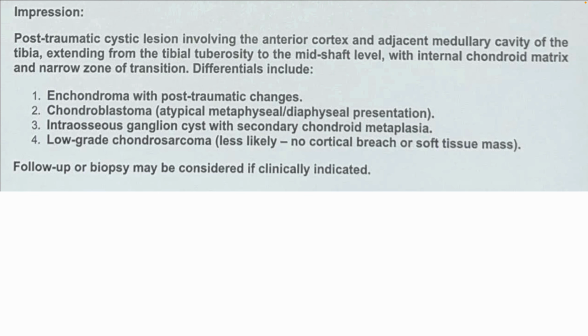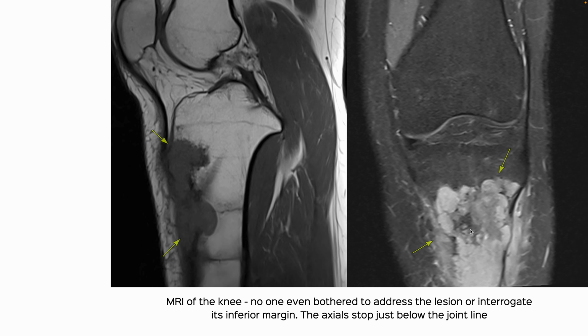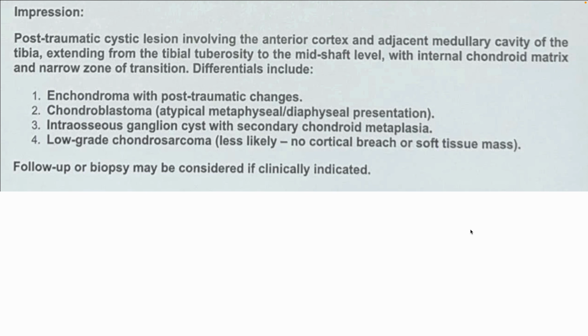This is what was reported: post-traumatic cystic lesion. First of all, that history of trauma is irrelevant. There was some mild history apparently. Cystic, how do you know this is cystic? You've not given contrast, you don't know. Internal matrix was picked up, very nice.